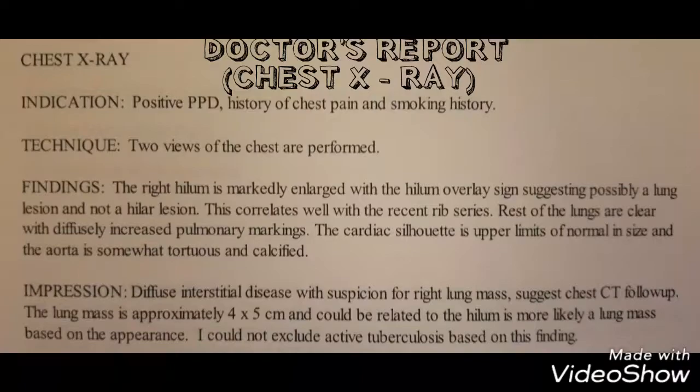Suggests CT follow-up. The lung mass is approximately 4 by 5 centimeters and could be related to the hilum, but is more likely a lung mass based on appearance. I could not exclude active tuberculosis based on this finding.